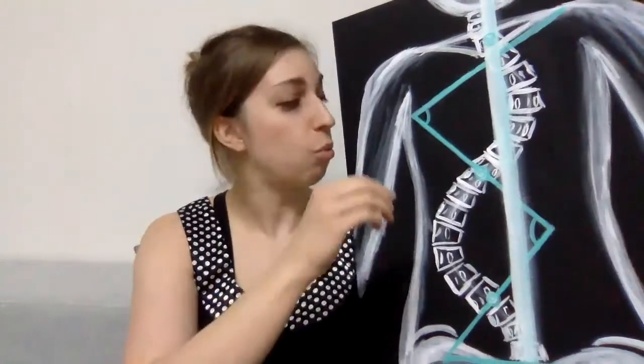So you could come see me and I'll measure it and say, I think it's about 29 degrees. You could go to someone else, they could look at the same x-ray, do very diligent measurements and tell you it's 24. And there's not a perfect, this person's right, this person's wrong. There's just variation depending on where people put their lines, slight differences in the way that they draw the angle.